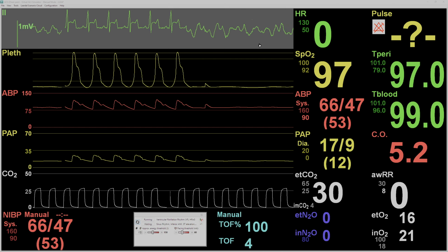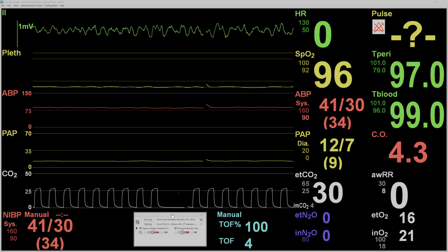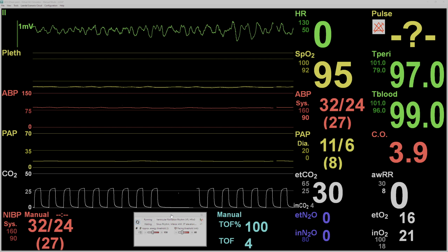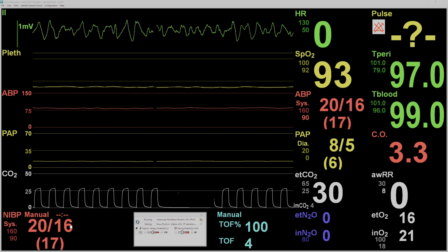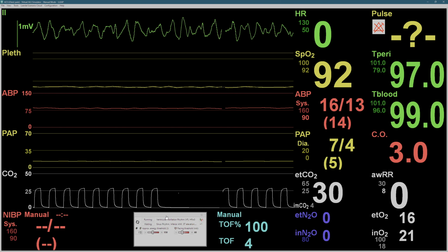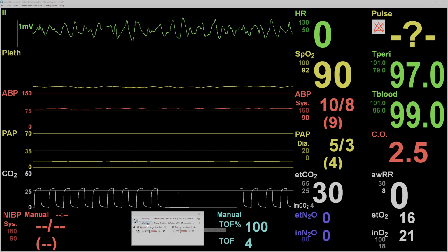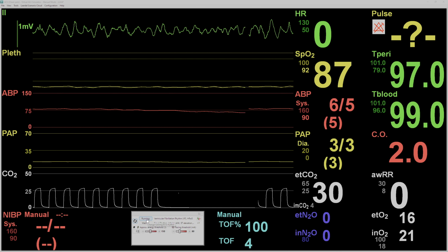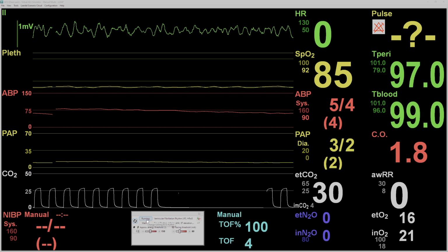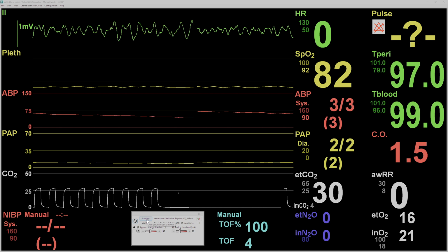So I generally will ask the student, hey, patient stops responding, what do you do? And you can actually see a live, like an arterial blood pressure over down here at the corner that I have settings for. And I'll say I'm going to go ahead and start CPR. Say, okay, well, this is the rhythm you're going to see until your next pulse and rhythm check. And then it may change.